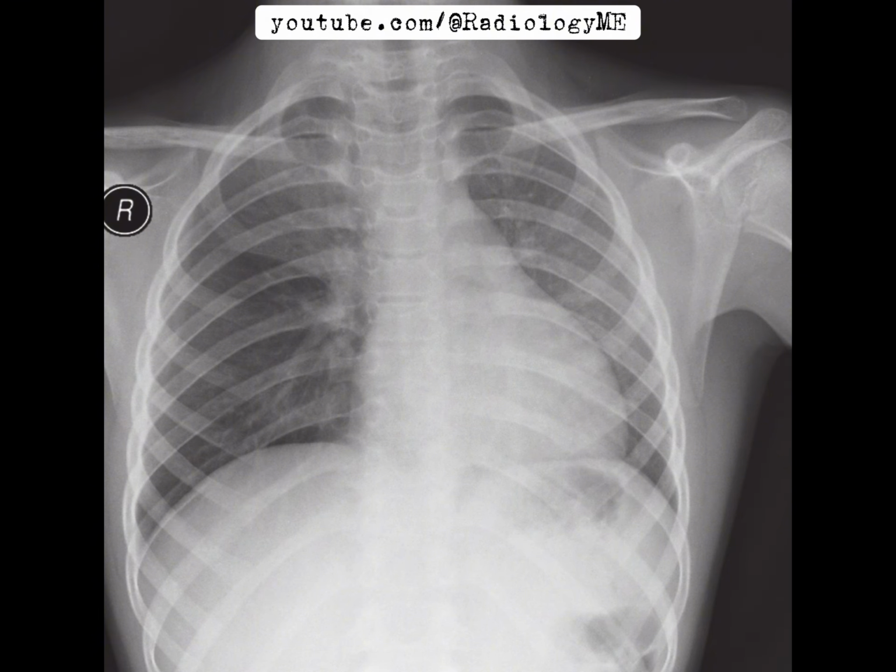With no other features of airways disease visible on the radiograph, I would favor a foreign body being the cause. If this were my case, I'd urgently discuss the findings with the referring clinicians and suggest bronchoscopy to directly visualize the bronchus intermedius, with the aim of possibly retrieving the object if, indeed, it's a foreign body. Bronchoscopy can be both diagnostic and therapeutic in such cases.